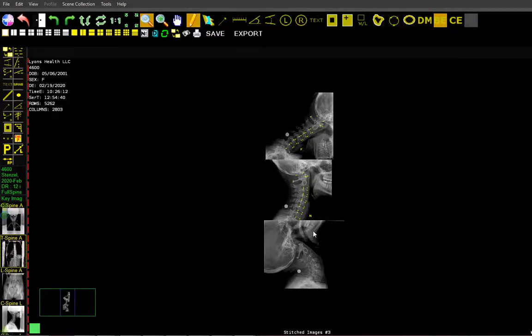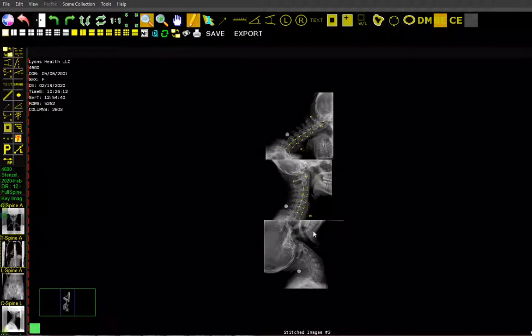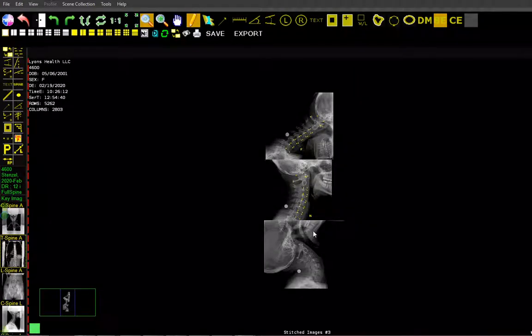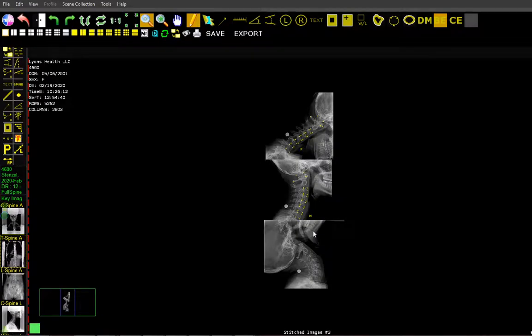We are proud to debut our Pennings Analysis software module for flexion and extension film analysis. If you do PI work, workers' comp work, or sports injury management, then you are going to want to take note and watch this video, because what we have done here is made your job a lot easier.